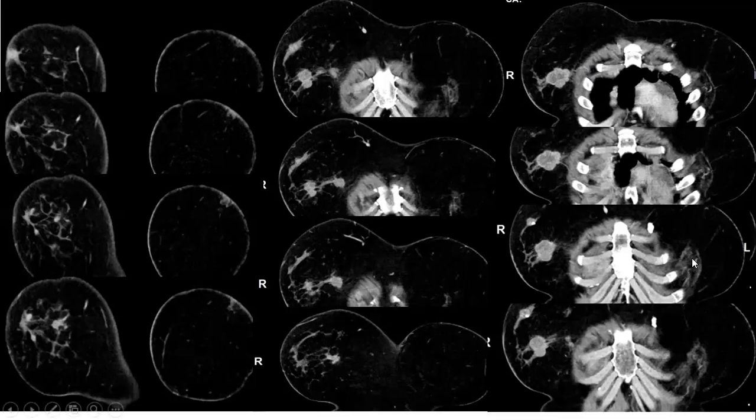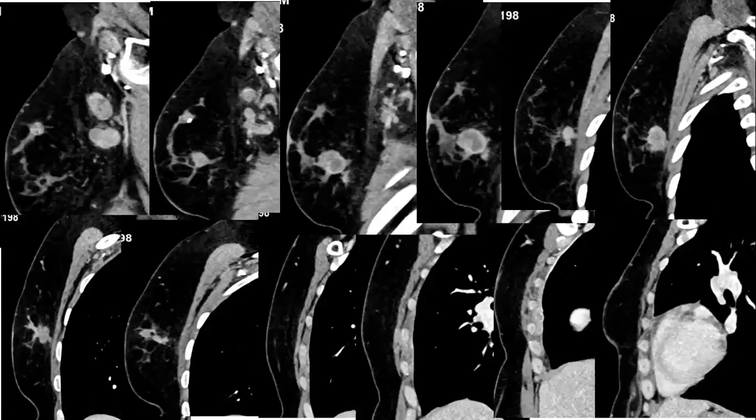But look for the contralateral, look for that area you have seen. It looks like a band-like, and there is fat within. Look at it here. Have you seen it? What does it mean? Again, the multiplanar, you can see here the malignant axillary lymph node, and look for the band, tumor band. See, you have seen on mammography between all of the lesions and the nipple involvement. And here also you can see the invasion into the adjacent pectoralis.